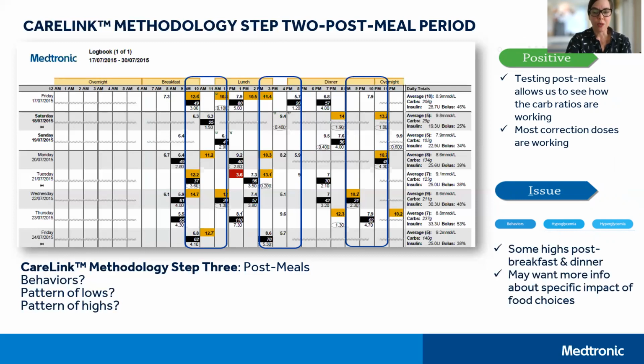The things we want to better understand are that there are some highs post-breakfast and dinner. We might want to figure out why that is to improve things for you. And we may want more information about specific food choices because the pattern isn't present after every meal.